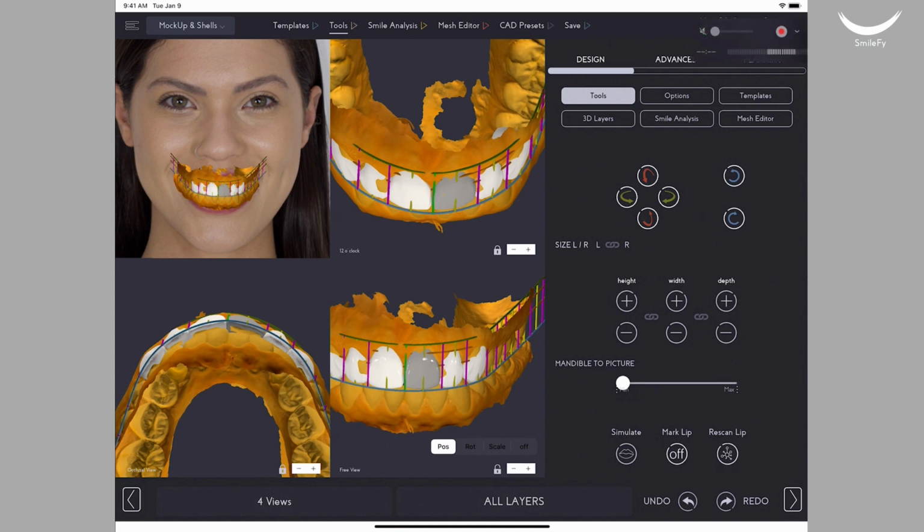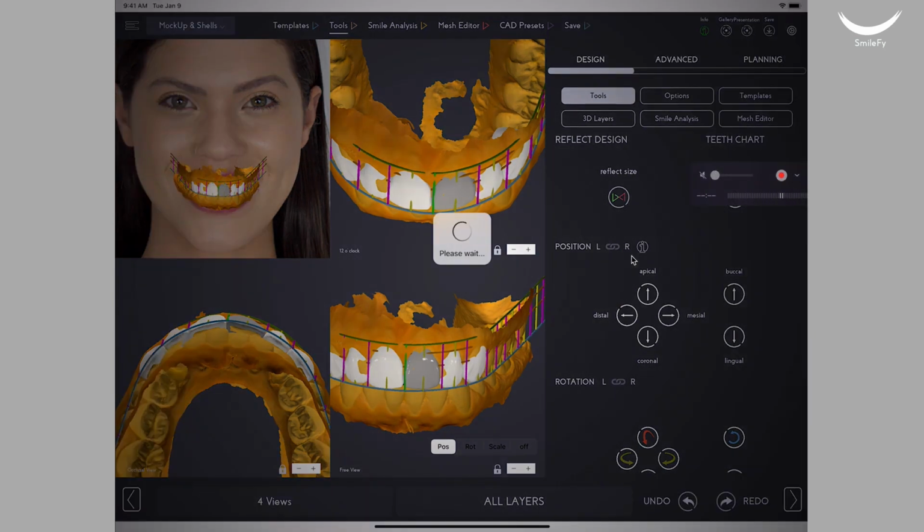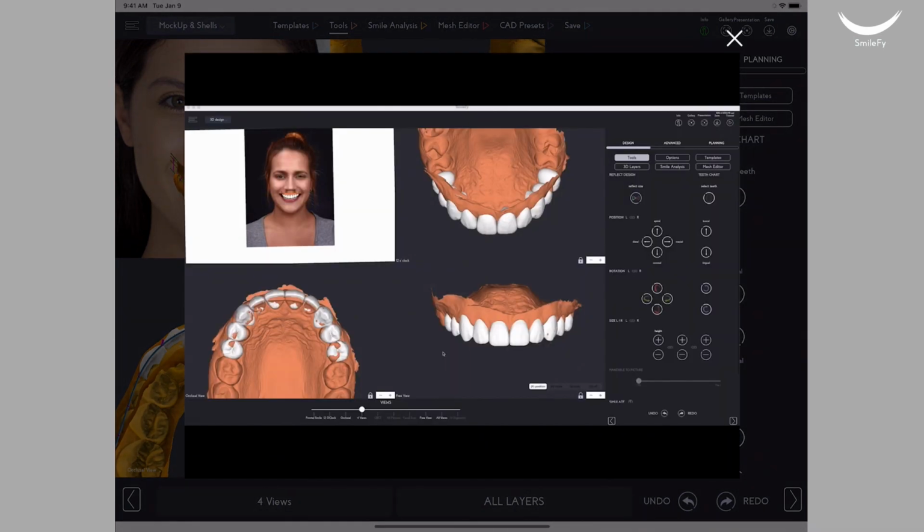If you look over here on the top, you tap on this button called info. Once it's turned on, notice that a little icon will appear, and if you tap on this icon, a little video will start to play for you to learn more on how this works.